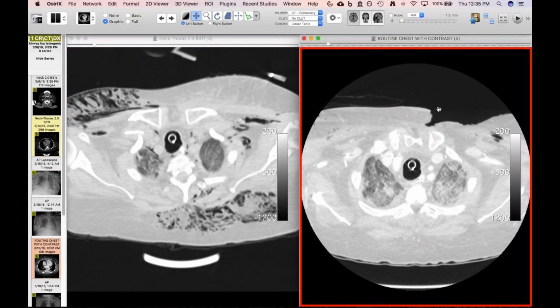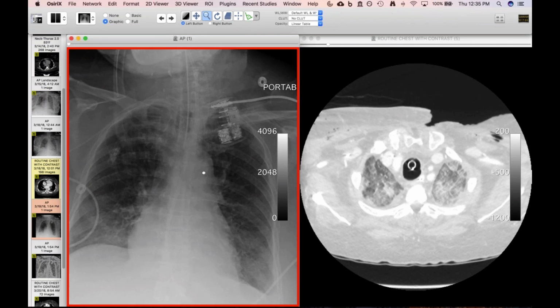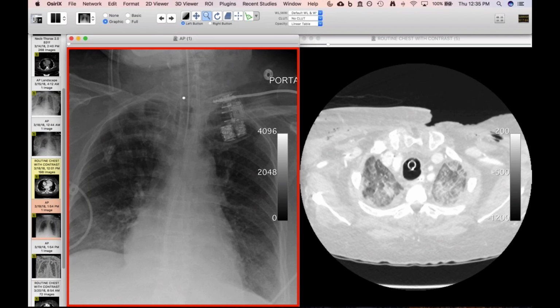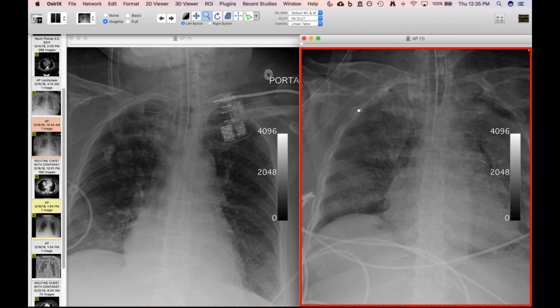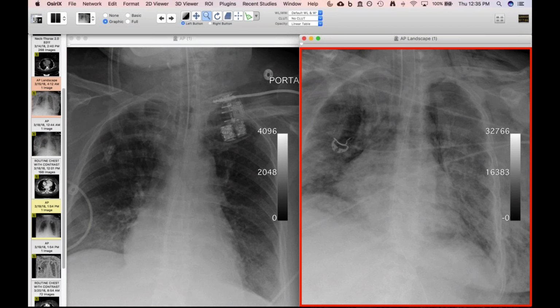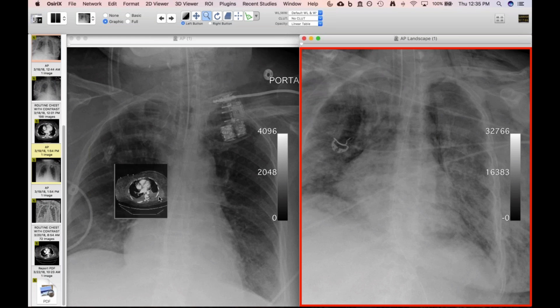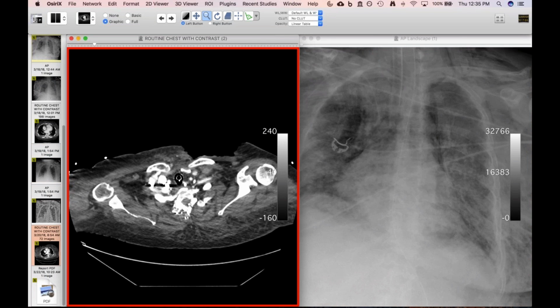And you can see she's undergone debridement for her necrotizing fasciitis. And there was a little bit of discussion the next day because I saw this radiograph and they repositioned the ET tube, and the pneumomediastinum is almost completely gone and the balloon is no longer massively over distended as here it was a little bit more distended. Maybe this one is where it was over distended. But anyway, they repeated the CT the next day because there was some doubt. Was it really ruptured or was it just over distended?